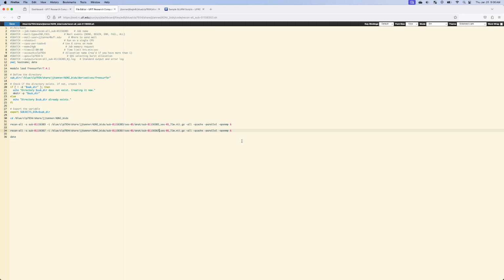So in that case, this is a script that really isn't just processing one person, now it's going to process both. And we could request more time just to be safe, whatever, 18 hours, that should be plenty on this. If not, it would end and you'd have to start over and request more time. So that's going to be one option. And that would be serial processing, and that's fine for a few brains, but if you have to do this for 200, you don't want to just run one at a time.